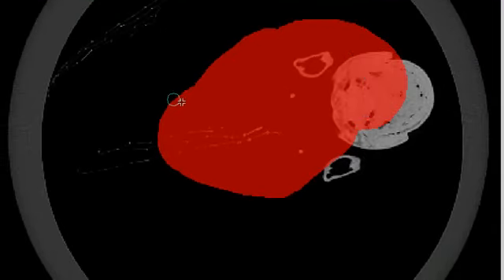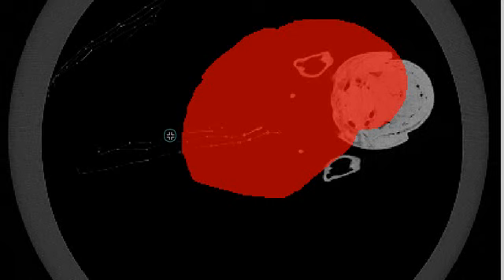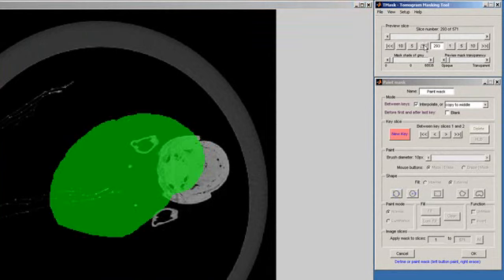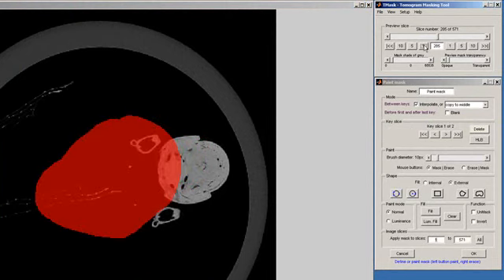I'll fill that area and delete a part of the mask here, for example. Now if I step back in steps of 1, the green shows the mask which is interpolated until eventually we arrive at the first key mask.